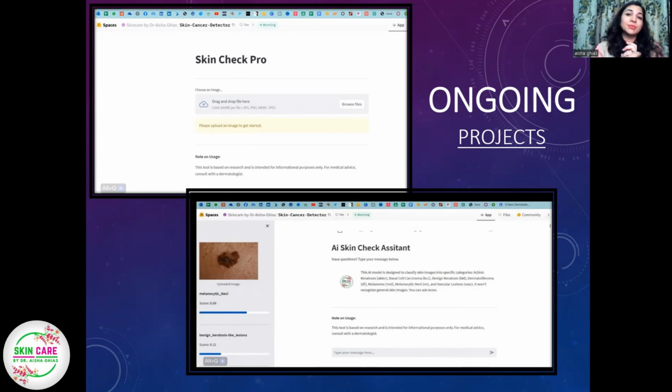So once you have captured the picture, you may not know what exactly it is, because sometimes we are not well versed with the trichoscopic or dermoscopic features of some disorders, and maybe we don't have time to go through all those features, and the mentor is not around. We can always send the picture and talk about the diagnosis. So what you can do with ease, in very little time, is put the picture into a software.